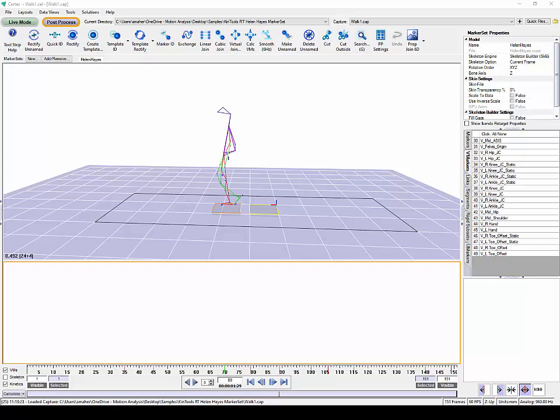Within our top display, we have selected our 3D view and selected an empty bottom view within our lower display. We have selected our lower portion of the data view, and that is apparent by the orange highlight around that data view portion. And this can be changed in a numerous amount of ways.